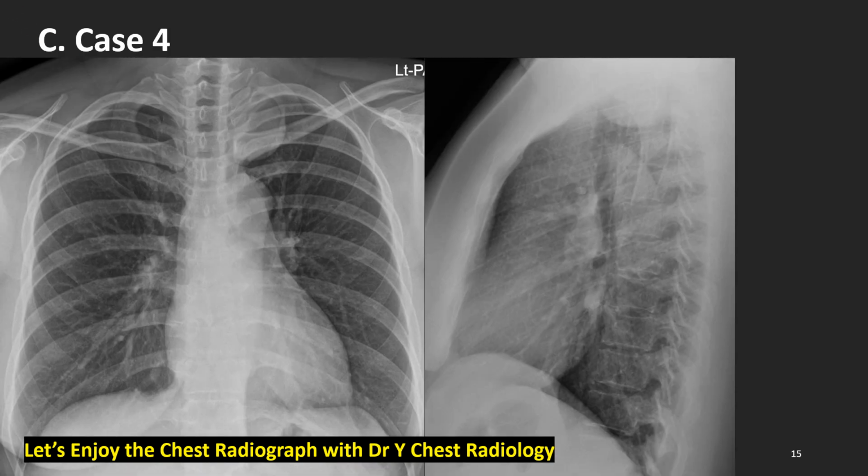Let's look at case number 4, a young woman's frontal radiograph. There is a 4 cm well-defined, mediastinally broad-based mass here, and half of the tumor is above the clavicle line, but the tumor itself is in the thorax, not extrathoracic in location. What does this mean? On the lateral film, there is a mass here in the posterior, paravertebral compartment.